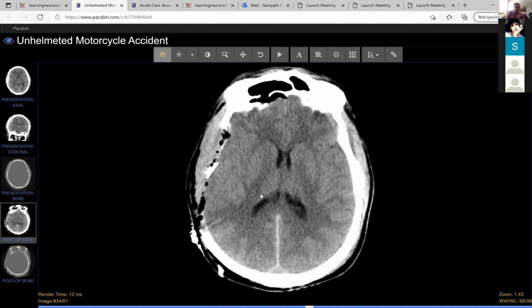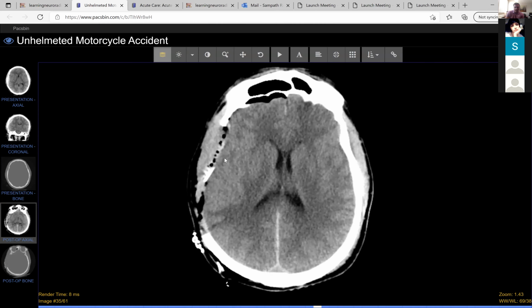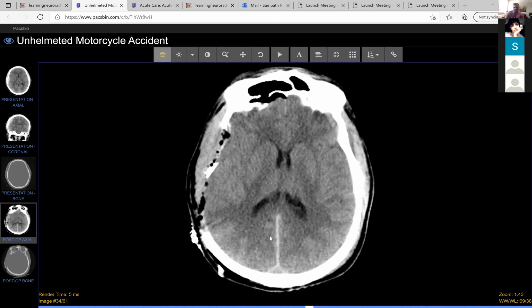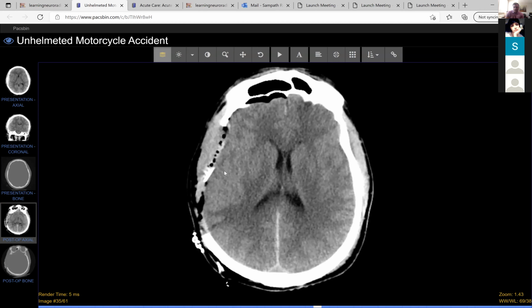They will drain out the blood right away, and I can see that this is the drainage catheter they have put in there, because if you don't do this, the patient will bleed in. And like we saw in the previous cases, when you have too much bleeding here, it's going to push the brain to your left side and cause a herniation of the brain down below. We saw in those cases, if they didn't do this, it would continue to bleed and push the brain to the left side, and then you'll start to herniate and the patient will die.